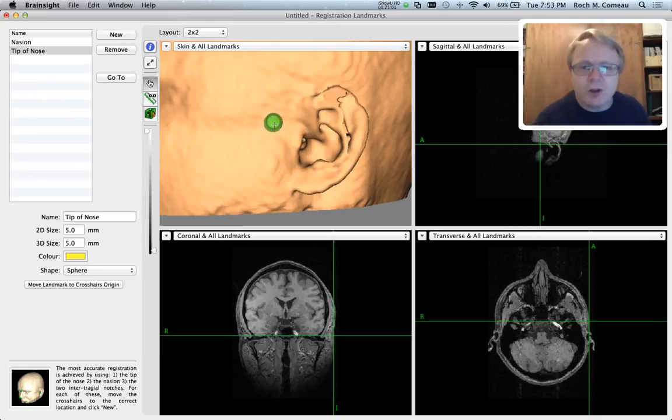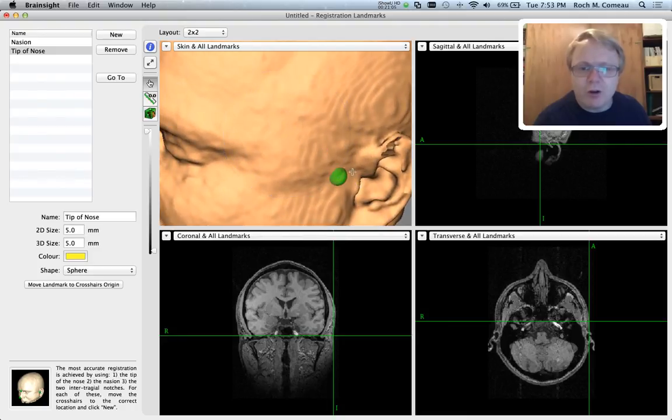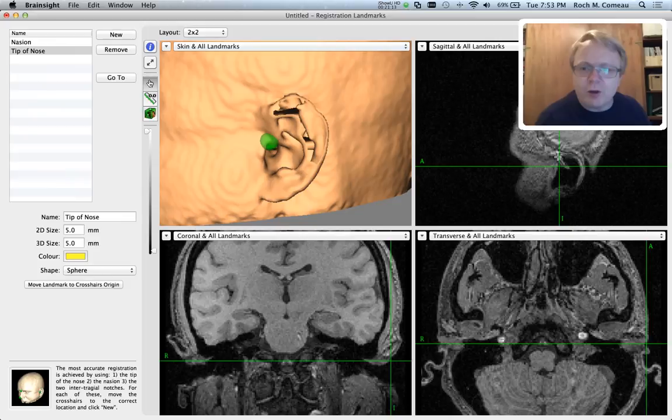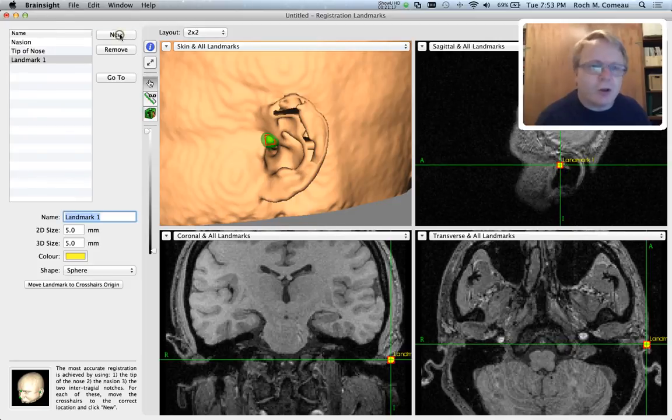You can see quite clearly there's a line here, right? If I zoom in here, this notch right there. So if I click right here in the posterior lip of that, that's a nice unambiguous landmark. You can see it quite clearly here. There's a little inverted V. That'll be a good landmark. So I click on that, and I can say left ear.